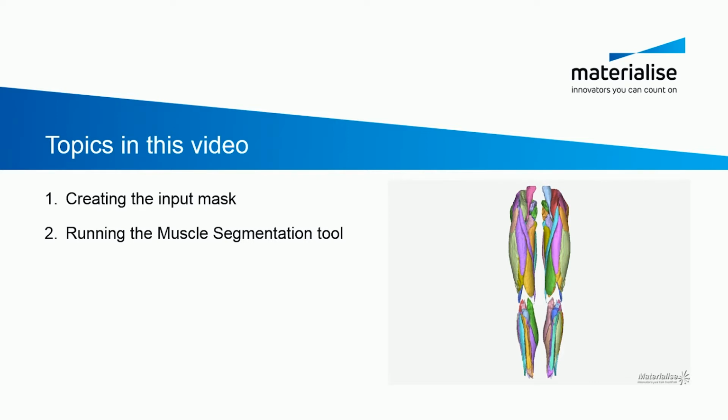So the topics that I'd like to cover in this video are, one, how to create that input mask, and two, how to run the muscle segmentation tool, so that hopefully you'll be able to also create results that look like that.